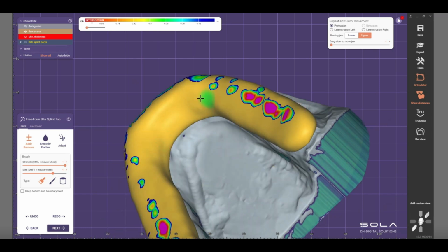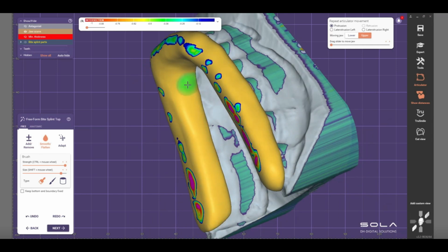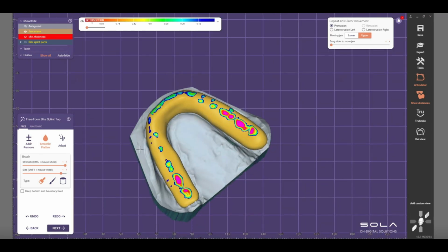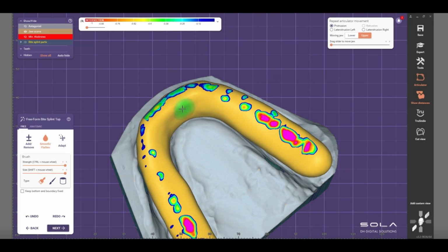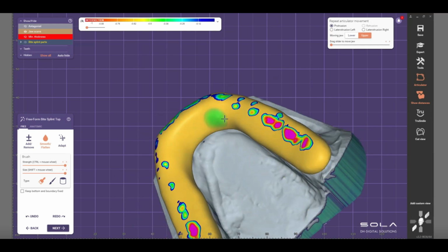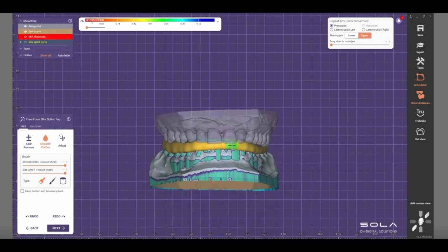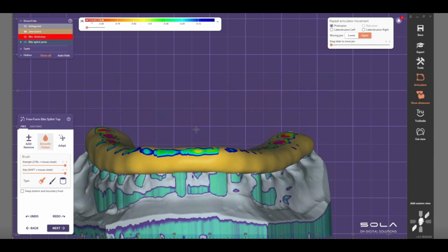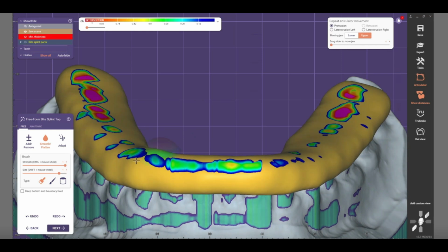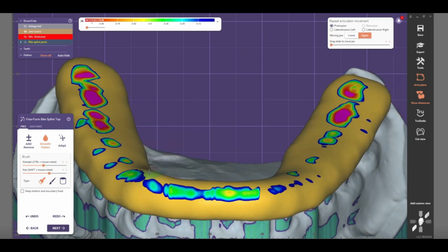So just make sure that you're symmetrical night guard and it's smooth. Then I would smooth it again. Smooth it on the top again, like that. Smooth it on the top and smooth this area again. And I will check by putting in my night guard, make sure that it is symmetrical. If there's anything else, I would go in and smooth the area here. Make sure they're flatter.